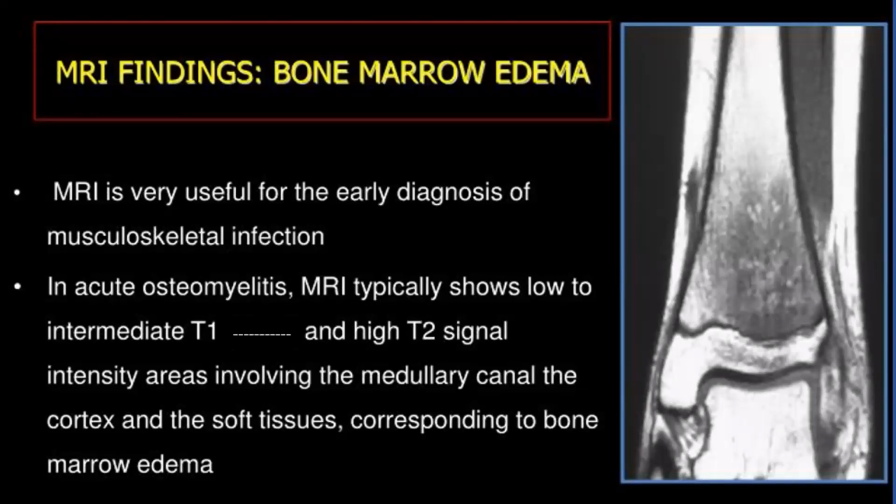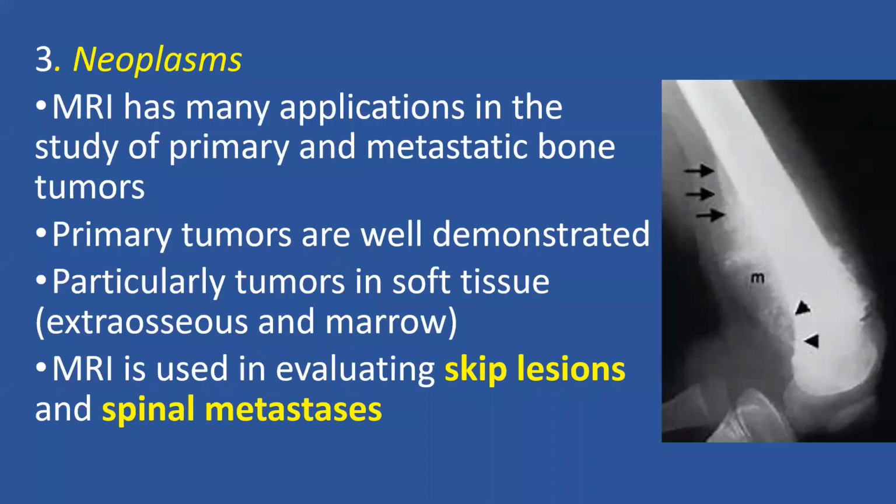Never forget this. We might give you an MRI, like in this slide, the X-ray, and tell you this patient has fever, etc. The patient has periosteal reaction. You can see that the periosteum is slightly elevated. You can see that there's inflammation around the whole ankle, and this tells you there's inflammation within bone. So this will help you and tell you when there is an infectious process taking place or not.